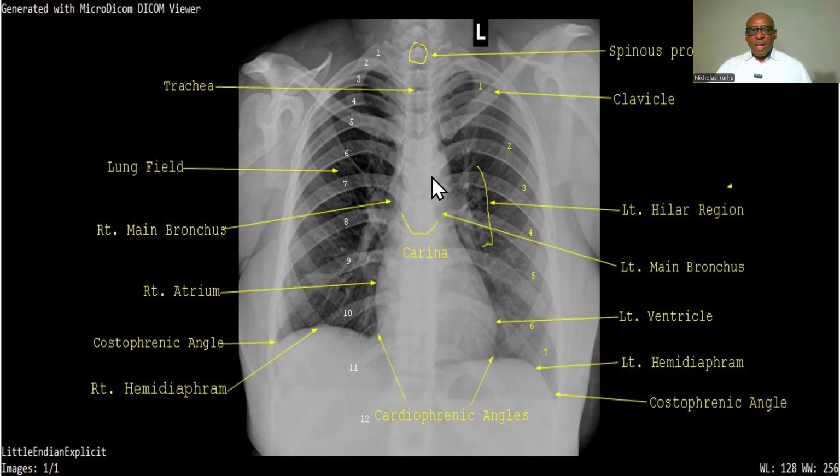Further, because the left ventricle pumps blood through the aorta, okay, on the left side we have the aortic knuckle, and that goes on to curve medially and further down to form the descending aorta or the thoracic aorta.